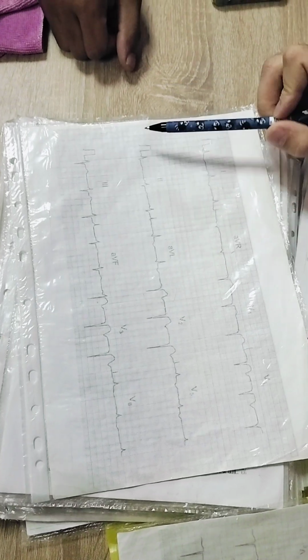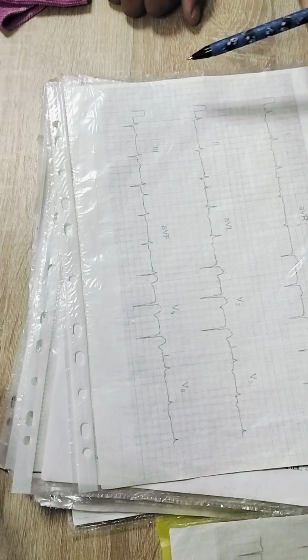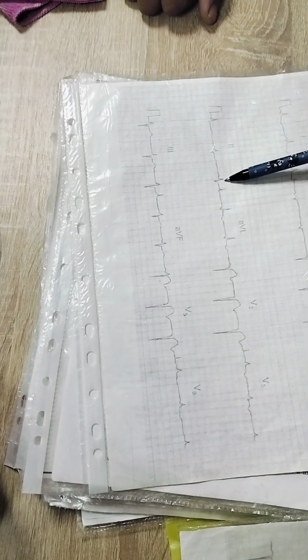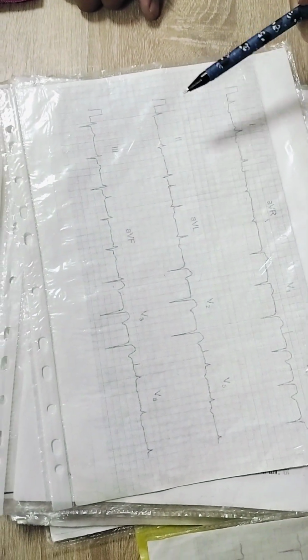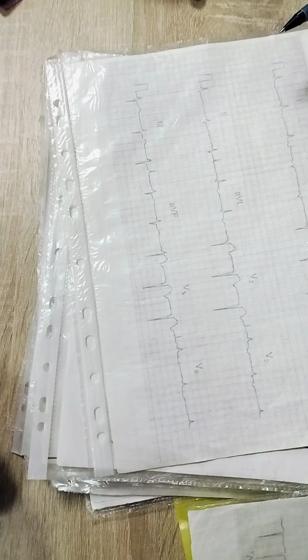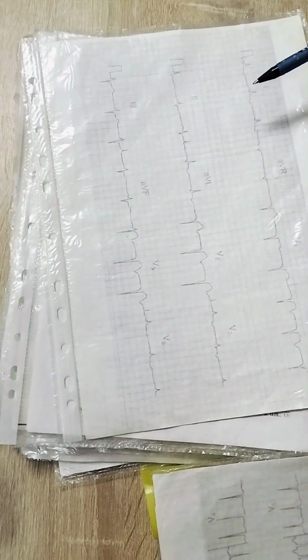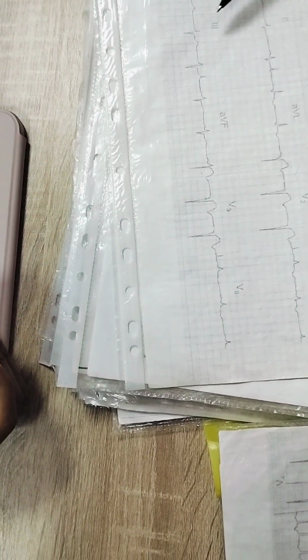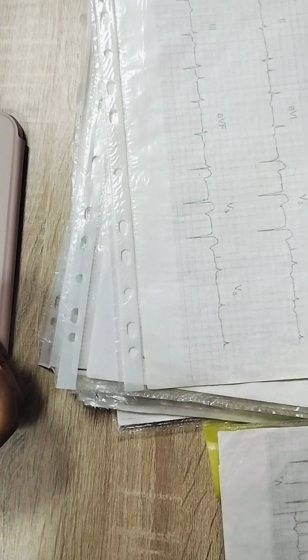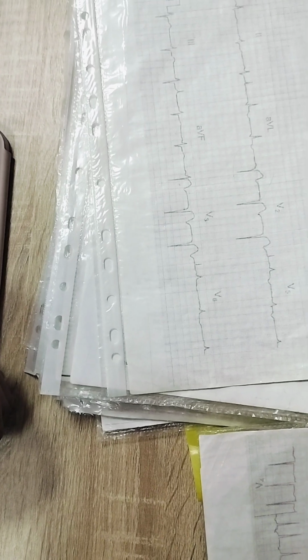This card quality is okay. P wave is here. Rhythm is regular if we compare these two complexes. So rhythm is sinus, rhythm is regular. Heart rate, we need to count it using formula. Electrical axis of the heart: this one is small, this one is small, this one is the biggest one. So it is shift of the electrical axis of the heart to the left.